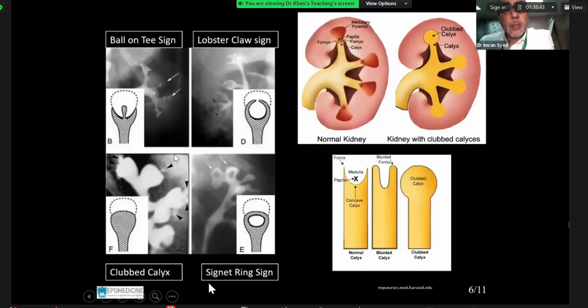So the signs, and this is important because renal papillary necrosis is referred to as sloughing of segments of the medullary pyramid, and this is a very good diagrammatic representation where some of this filters and sloughs off into the collecting system, and therefore the contrast on the residual aspect of the renal medullary pyramid is what's left behind, and that creates the lobster claw sign after the residual sloughing has already occurred into the collecting system.